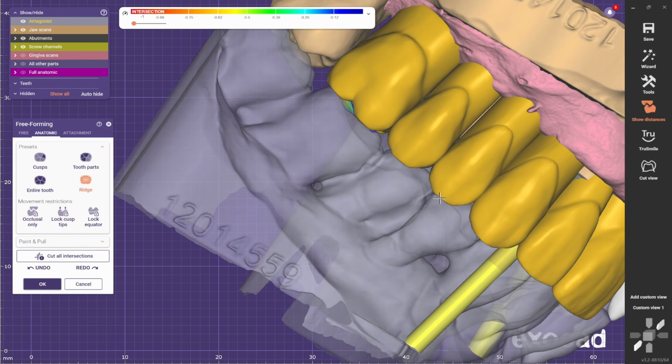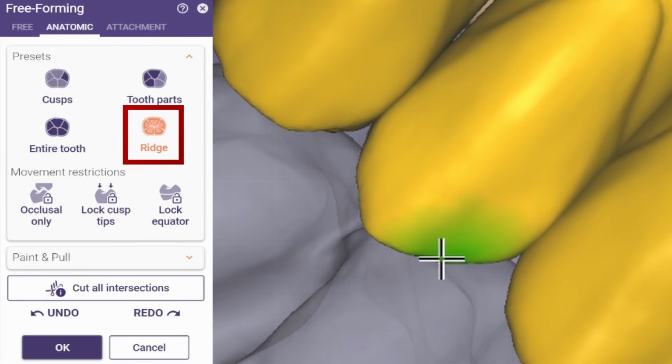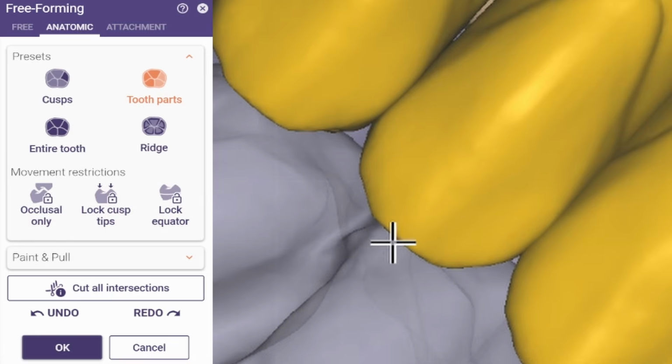This library comes with flat cusps, but you can easily make them pointy with this technique just by doing this, and this library is quite versatile.